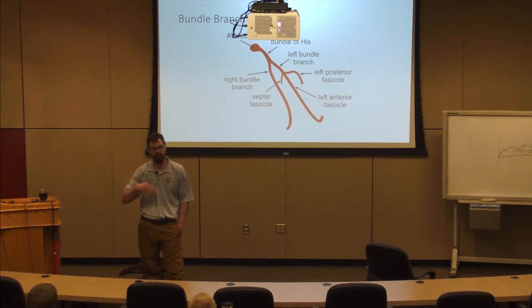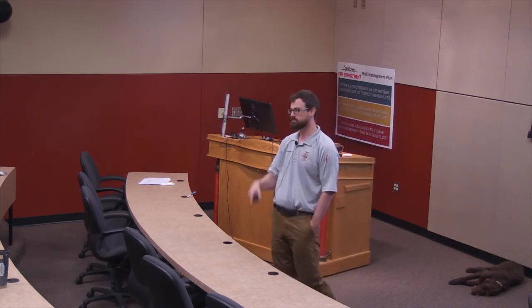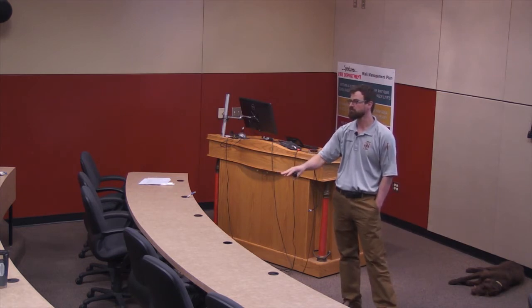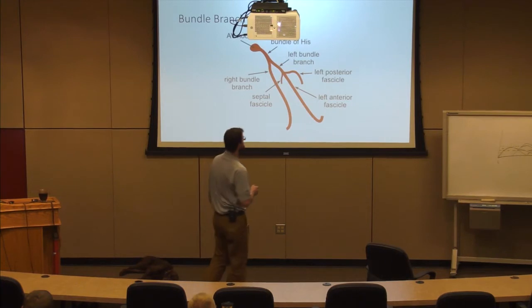So you have to be able to look at a 12 lead and say, that's a bundle branch block. And you have to be able to look at a 12 lead and say, that's wide, but that's not a bundle branch block, that's bizarre. Bizarre wide means electrolytes and toxicology. Normal bundle branch blocks, I don't worry about. Make sense? So you really have to be able to look at an EKG and say, I'm 95% confident that's a bundle branch block. So we have to spend some time briefly reviewing bundle branch blocks.